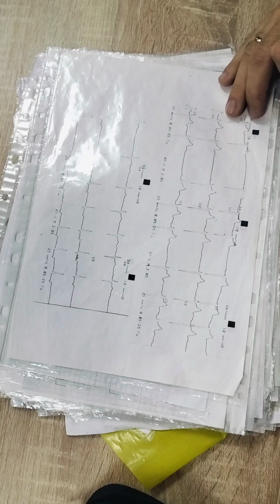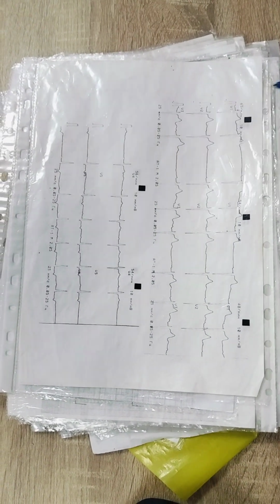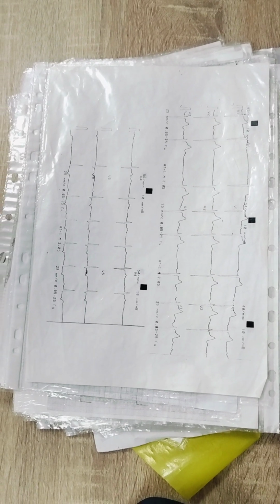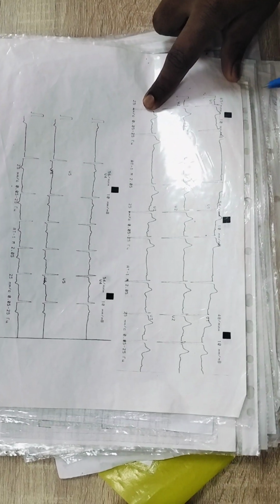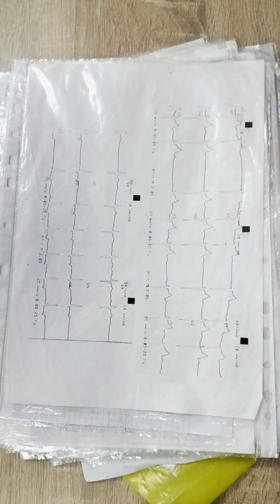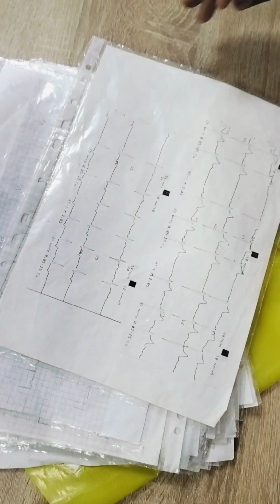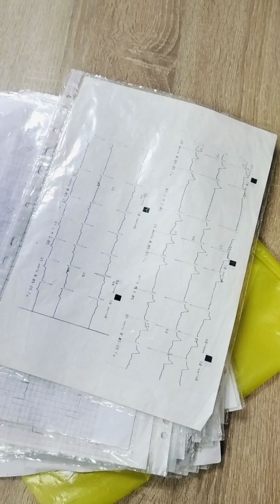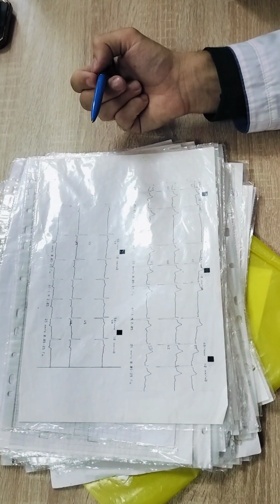So, if there are no clinical signs of ischemia, ischemic changes in the ECG in the hypertrophy of ventricle are possible. You said hypertrophy because of this graph. Because of S wave is big, R wave is small here, and R waves are big here. And you said levogram because of electrical axis shifted to the left. So, patient can have two problems: hypertrophy plus ischemia.